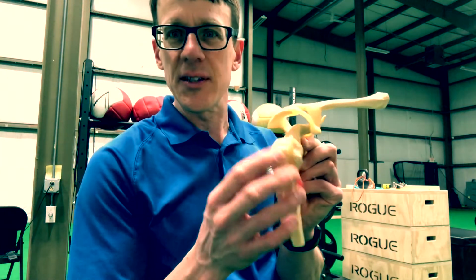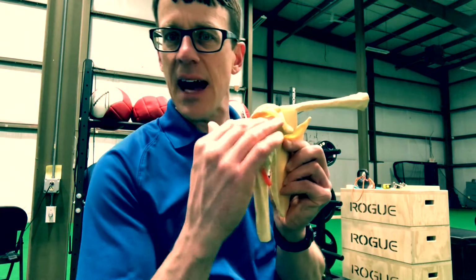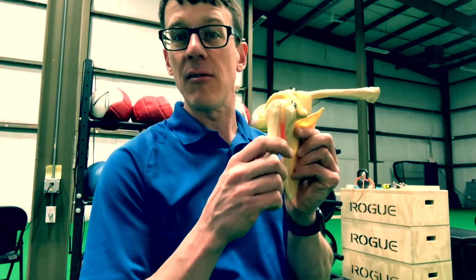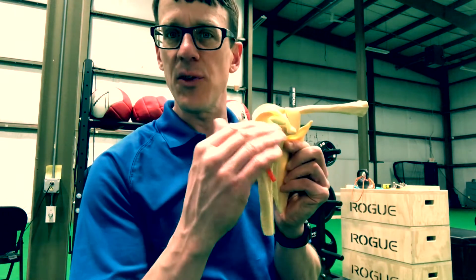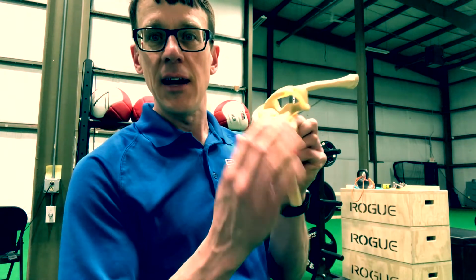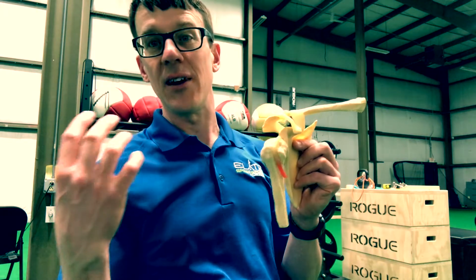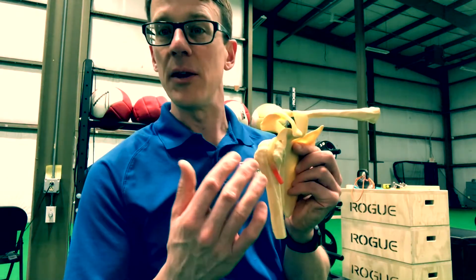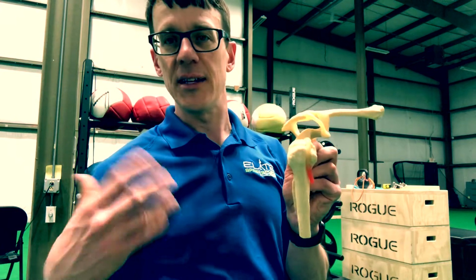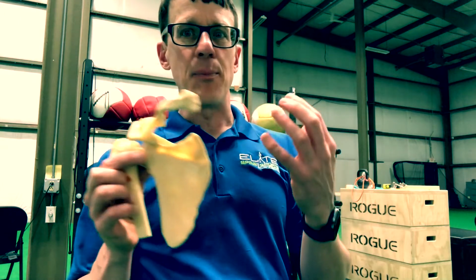So that's kind of what they're going to see with fluid buildup in that area in little tiny sacs that are meant to make things move freely without friction. Those sacs get banged around, and that's called bursitis. So this little thin bursa now gets banged around by a rotator cuff not doing its job, and now you get swelling in the bursa. You'll get an aggravation of the bursa itself, and then you'll get bursitis. So they'll say subacromial bursitis. That just means that bursa sac underneath this shelf has filled with fluid and then has become aggravated. So that's basically the main findings.